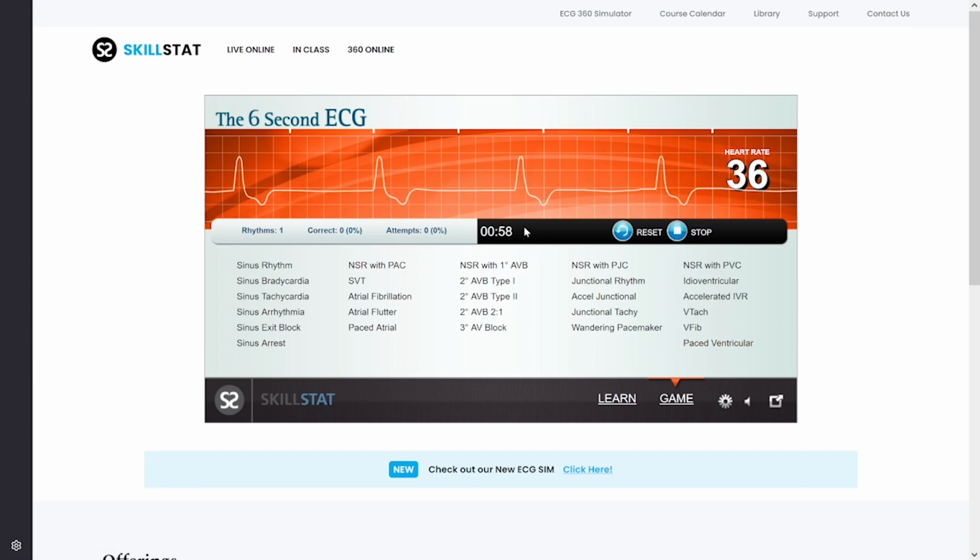So right here, we have a flattened P wave. We have a wide QRS complex. We don't really have a visual of a T wave. So what are we thinking is going on here? And I think I already have a pretty good idea of it.